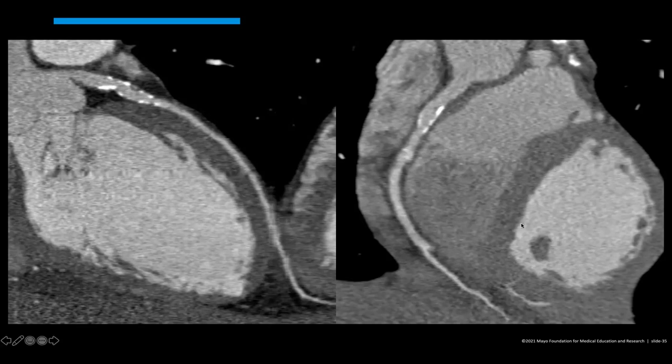And then you have the left ventricle that forms the apex of the heart, and it's up against the left lung over here. So we have left ventricle with some very large papillary muscles, smaller trabeculations, interventricular septum, right ventricle. The right coronary artery goes in between the right atrium and the right ventricle.